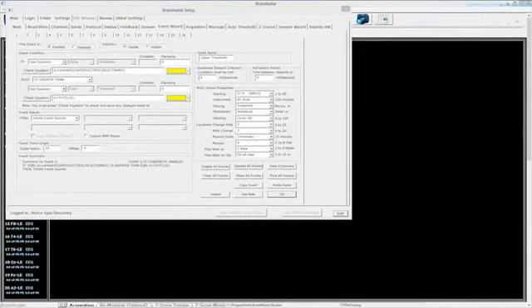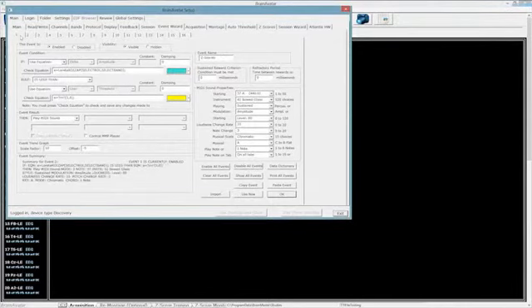So right now, this says if it's less than my upper threshold, play the MIDI sound. Well, without putting this in right here, when it's lower than my lower threshold, I'm still going to hear sounds. So you need to prevent that from occurring. On the other end, you also want to make sure that when it goes above my upper threshold, I don't want any sounds to occur. So by having these 2 events right here, this basically locks my sound into only occurring when it falls in my upper and lower threshold as far as rewards occur.